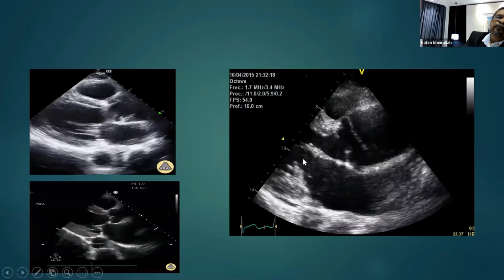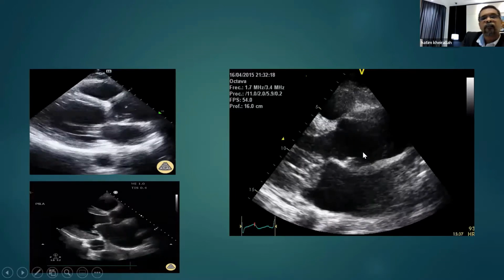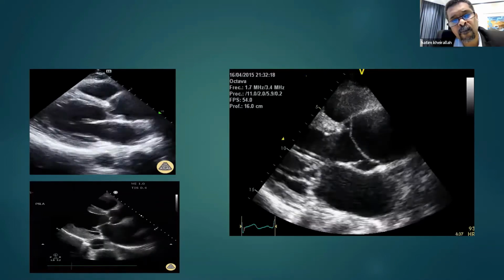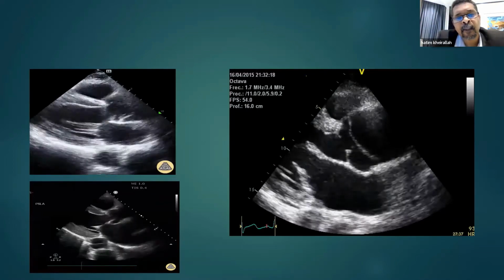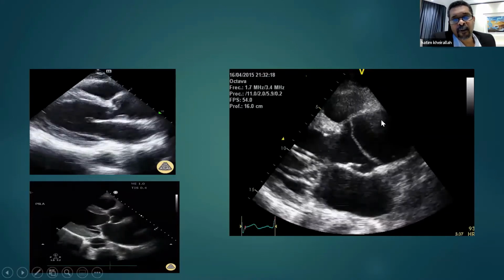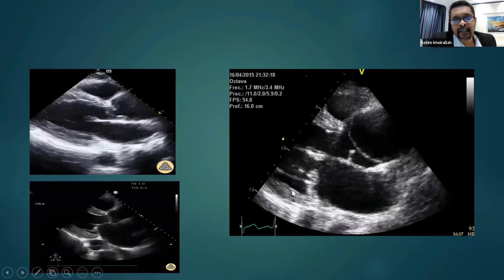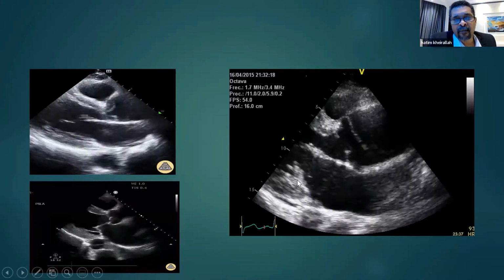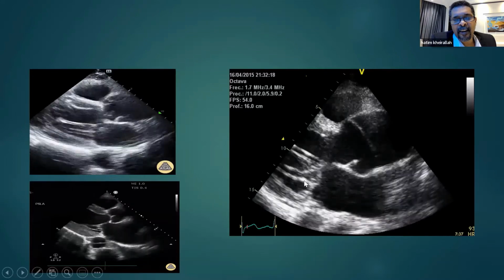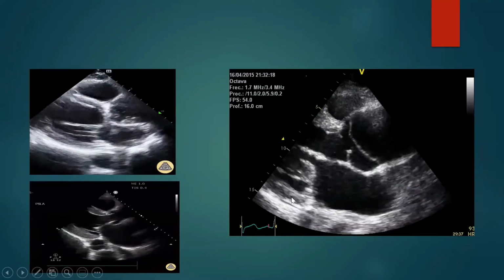Now, what other abnormalities do you see? This is again, I might say self-satisfying because you focused on this and you forgot about seeing anything else. But there is something so serious here in the mitral valve. Mitral valve. What else?